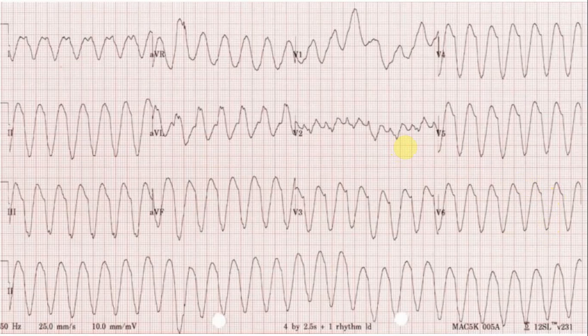I am very concerned about this patient. My immediate action would be to assess the hemodynamic stability of the patient. Then I'll give appropriate treatment such as DC cardioversion under procedural sedation. This is a bread and butter ECG for any emergency medicine doctor. Really impressive findings. Hope the patient is doing all right.